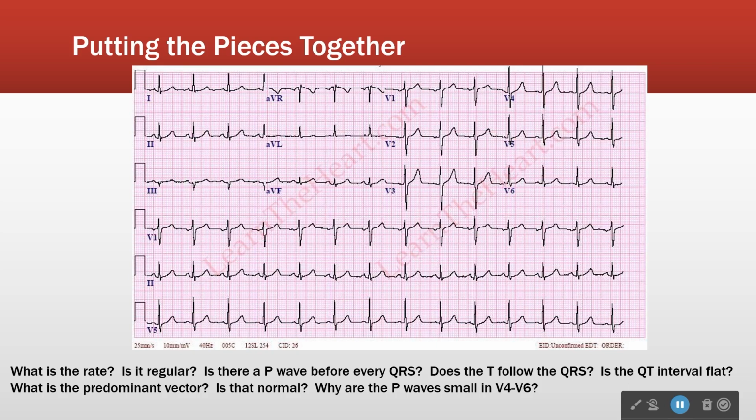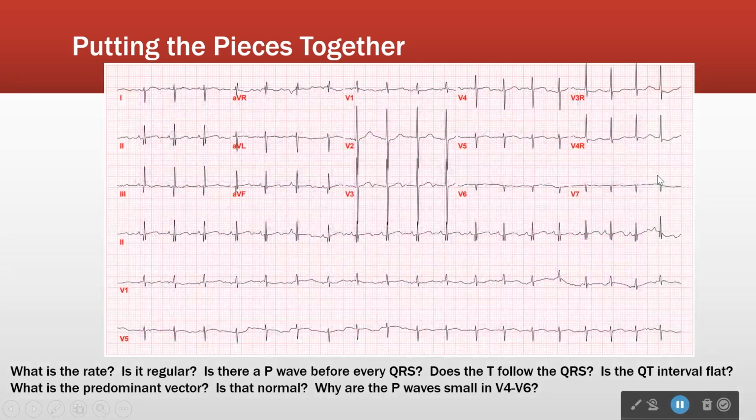So that was a normal EKG, and now an abnormal EKG. Normal, right? So P, QRST, that is how we should see this. There is maybe a tiny little bit of ST depression there, but not anything we're going to get worked up about. Okay, here's another one.